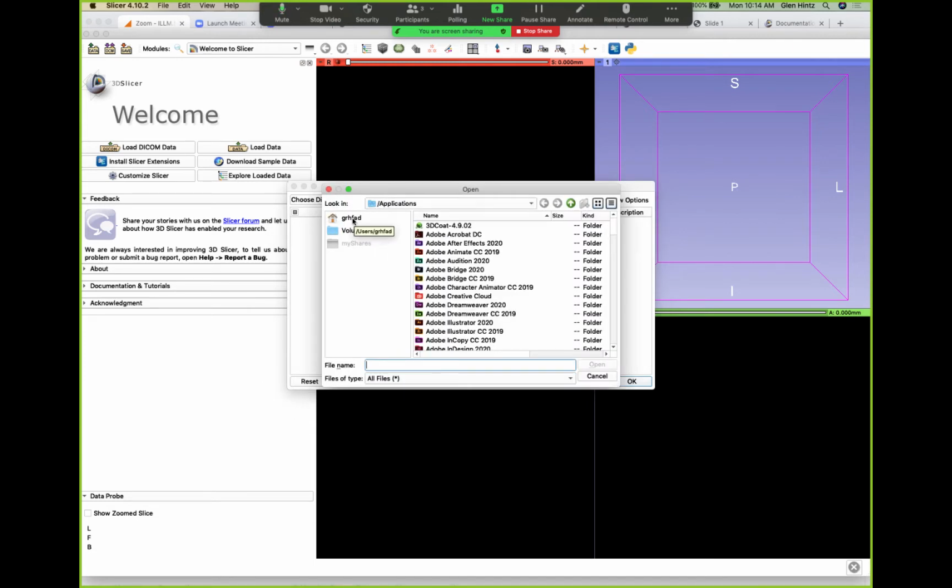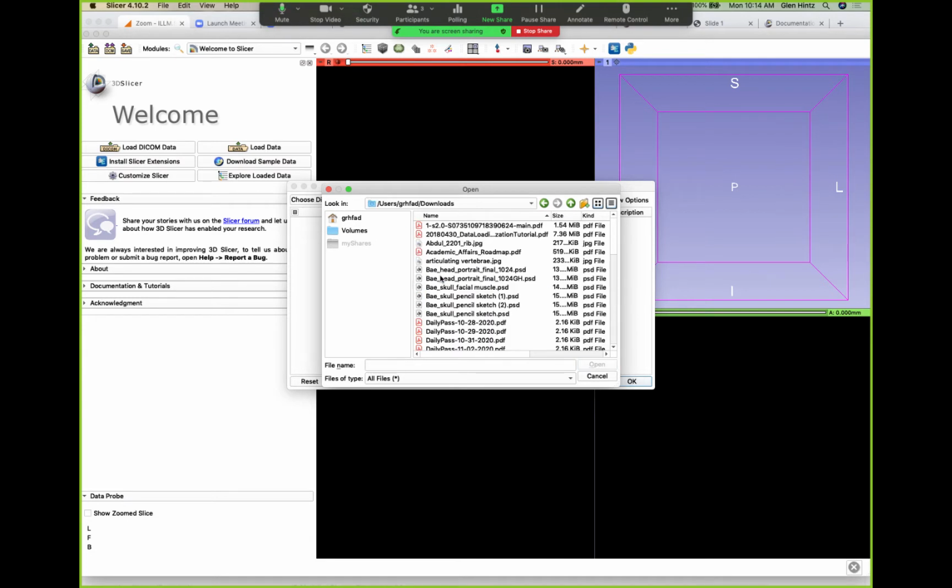Now in my download folder, I have that shoulder directory that I downloaded from the University of Iowa. And you notice there's one option or one file out of the total. So like I said, it's about 1,000, right? I guess it's only about 500.